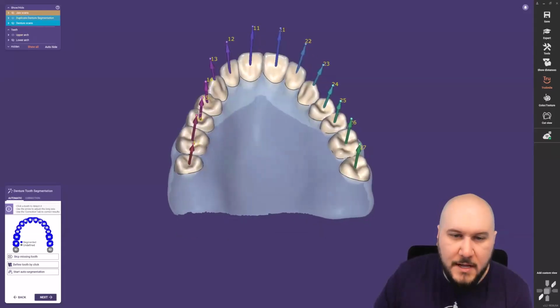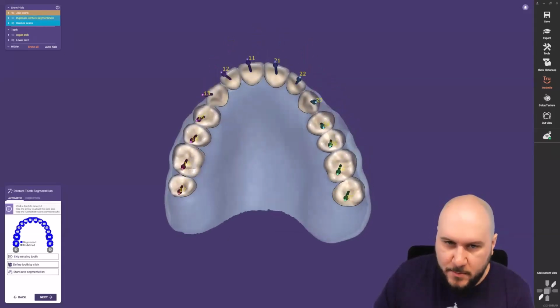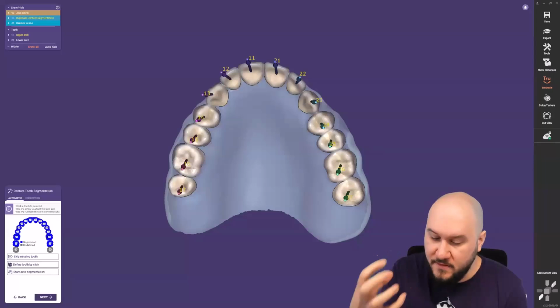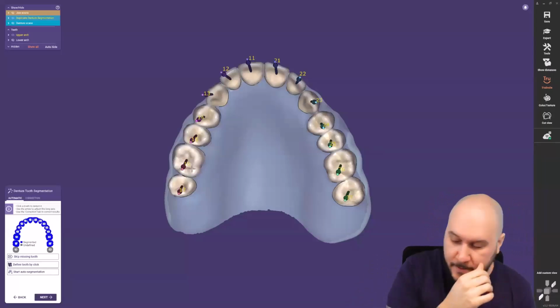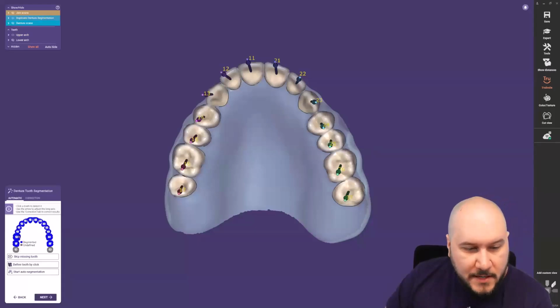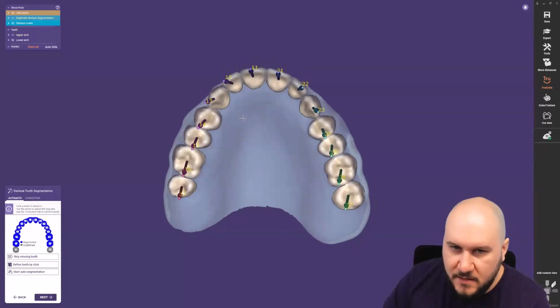Depending on the scans, or depending on the washed borders here, the software did our calculation about this, because we want to have that one later on separated. The markings of the tooth, set up as an STL, and also then the denture scan in this case. You can see directly here everything is segmented, as we also mentioned in the DentalDB. There is also a possibility to correct it, but I think we don't need it in this case.